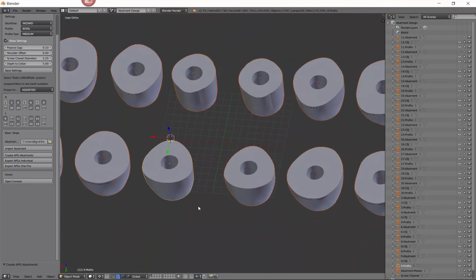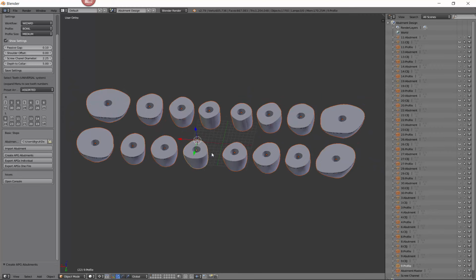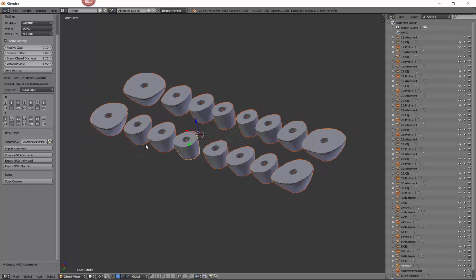All right, I'm going to leave it here. I'm not going to bother exporting these. You guys know how to do that. Hopefully this video helps you to create your own healers from a non-included abutment file.